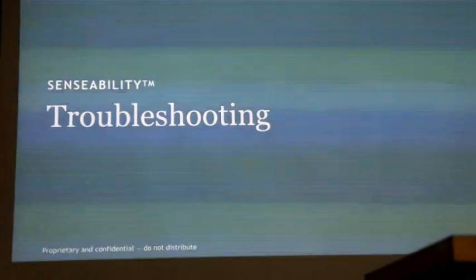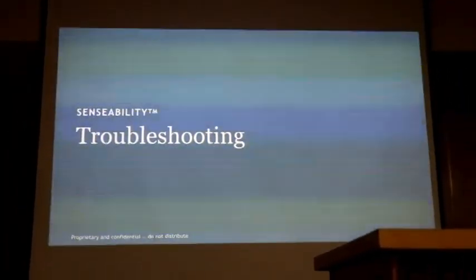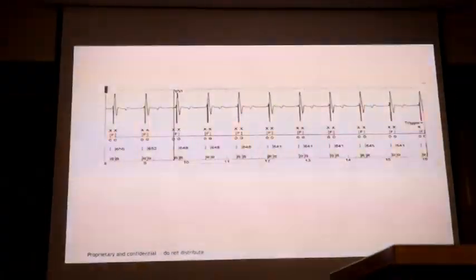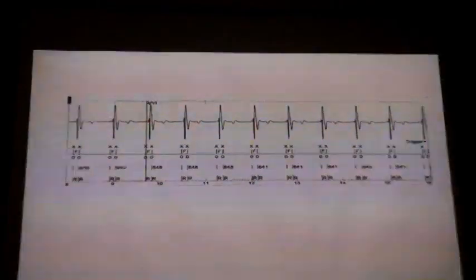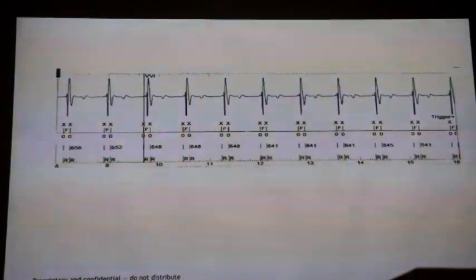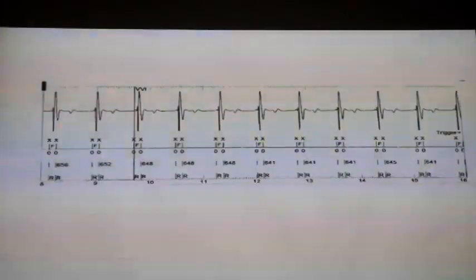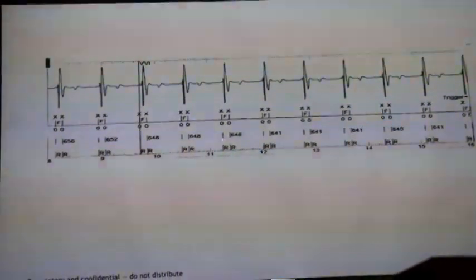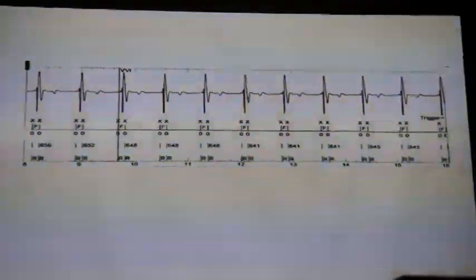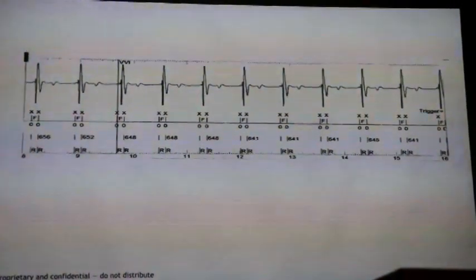Okay, so some troubleshooting of sensing, right? This is what we all love, isn't it? This is what doctors love. Give them some trouble, get them to fix it, right? Okay, so here we have a defibrillator lead sensing. So this is double R-wave sensing. We've got a marker here, and the signal is seeing it twice. If this is an implant, we want you to move the lead. This is not an implant.